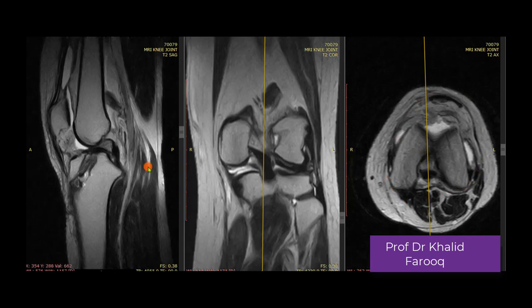This patient had a history of total ACL transection, and later on he had ACL grafting. Now this is post ACL graft. The patient has a history of knee instability even after surgery.